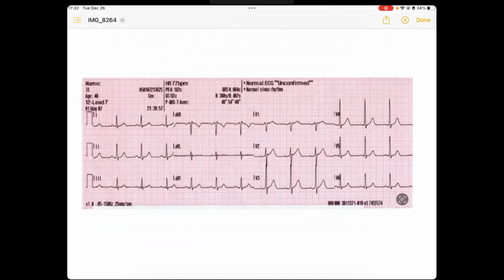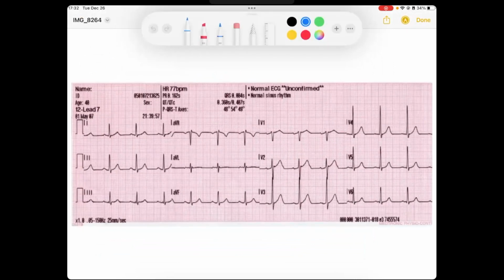And so let's talk through what I look at in this case when I'm looking at the forest. So this is my forest. I'm looking at my trees. I'm looking down, say at the bottom here, and I see a tree. They're all happening kind of on time, right? I look at them, they're narrow, real narrow. They look like they've got this PQRST complex to them. Nothing's popping out of the screen when I look at this. Okay, so that's the way I might look at the trees. I see just P waves marching along. I don't see any weird stuff in between. Just getting a quick look at what I'm going to be dealing with.